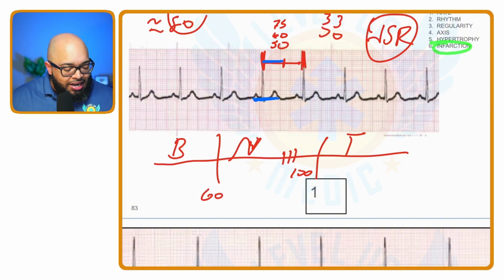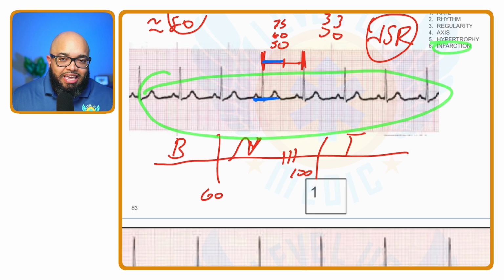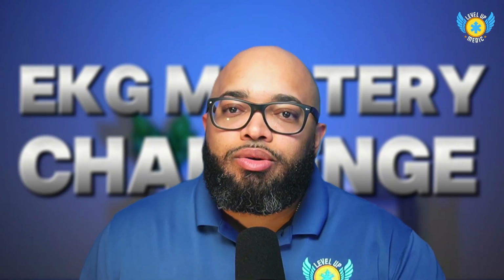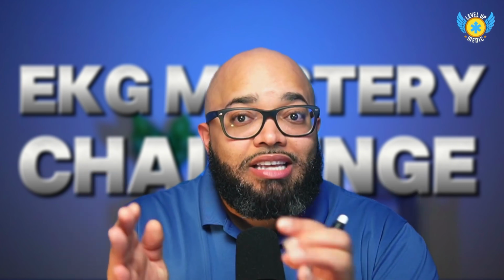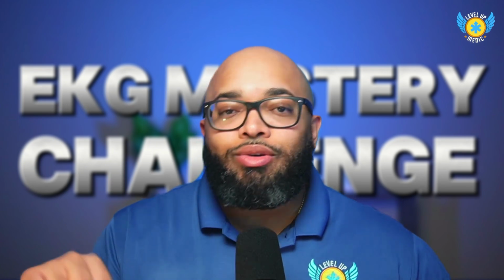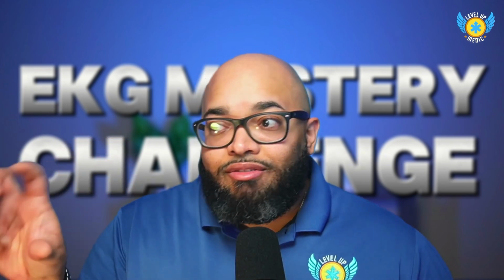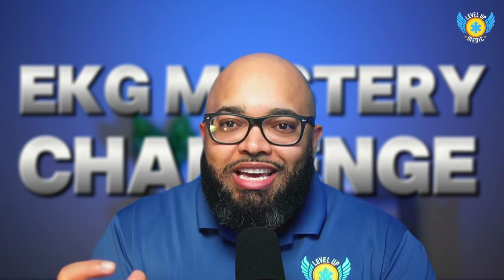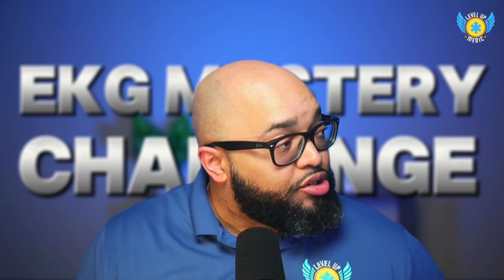And for infarction, I can see evidence of infarction in a lead, but I need at least 2 leads that go side by side, so in a group. So for instance, it needs to be like V1, V2, V3, V4, V5, V6, or 2, 3, aVF, right? It needs to be groups of leads for us to recognize infarction. Okay. Now let's go to number 2.